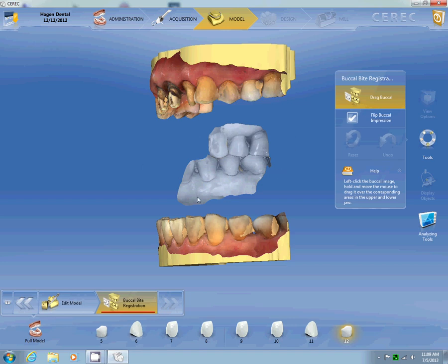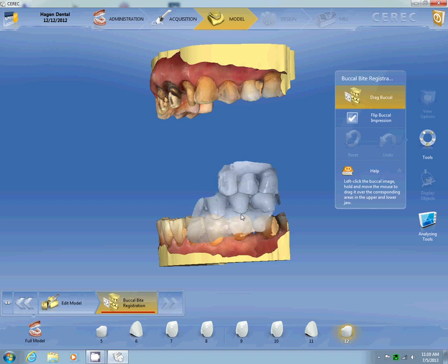All right, so here we've got our newly trimmed buccal bite. You can see I had to trim off quite a bit, but now if you look at what's left on our maxillary arch, most of what's in our buccal bite is now actual common data. We've trimmed away everything that was uncommon. Even our prepared veneer prep here was unprepared here. Let's see how we do now.